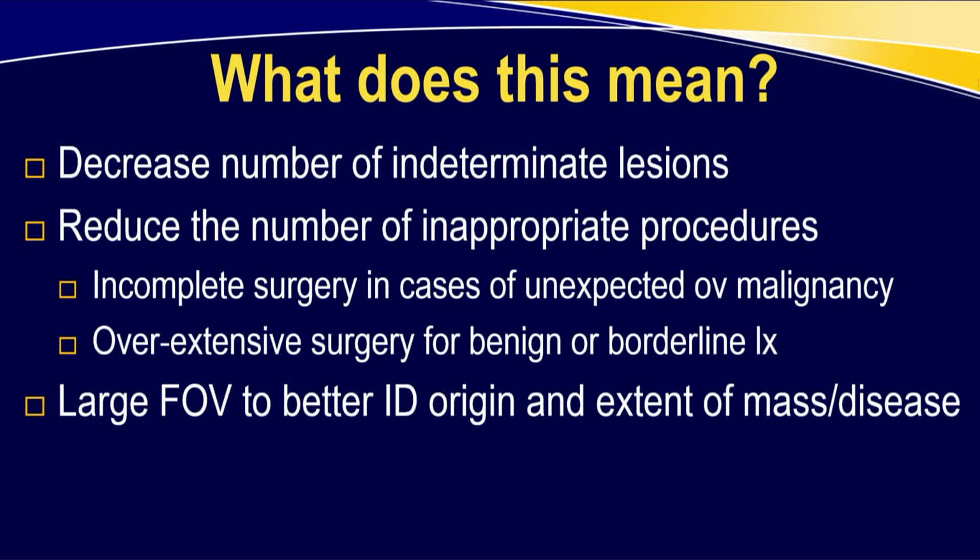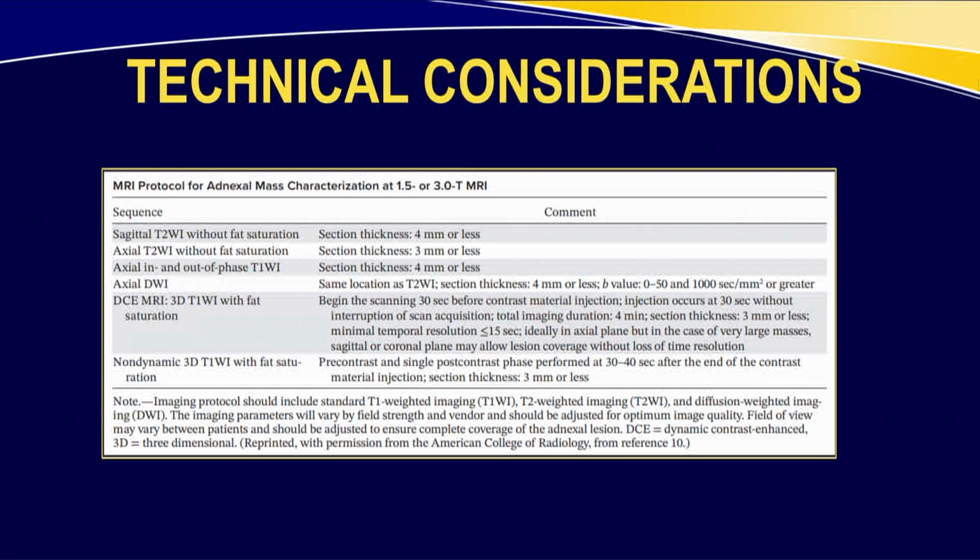Also, MR's large field of view allows us to better identify the origin and extent of some diseases, because not every adnexal lesion is ovarian in origin. So that large field of view gives you some more information.